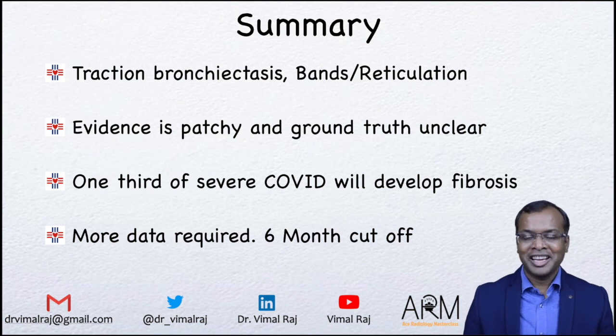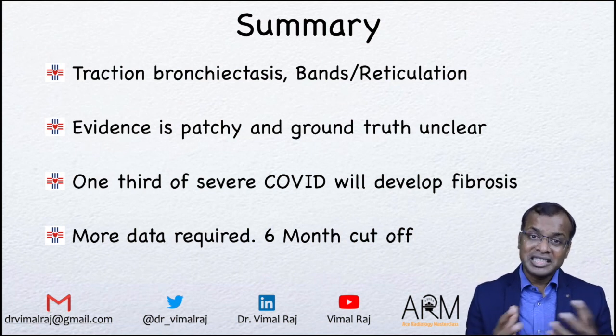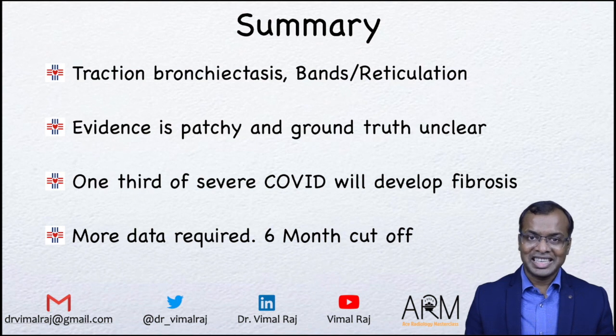So hopefully I have given you enough of thought to process, and also I have shown you enough images for you to understand what the post-COVID fibrosis appears like, how it's going to be different from what we are seeing in interstitial lung disease, and what it is going to mean to us in future.